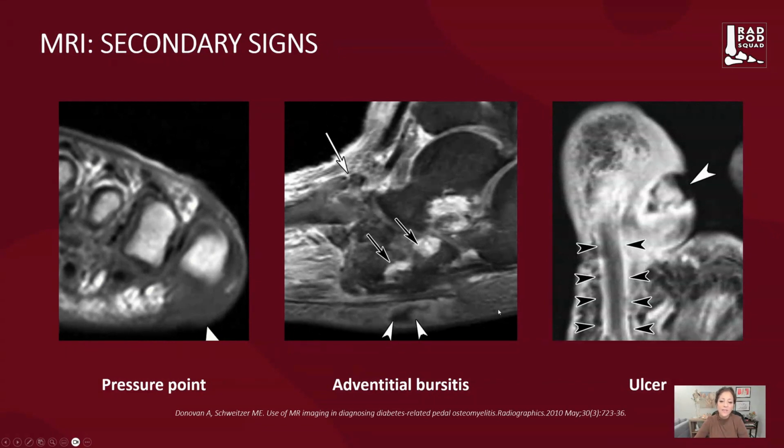So in the case where we begin to have a situation where we alter our weight bearing, in Charcot arthropathy, we begin to offload areas that are causing us pain. And in this case, we can see on this sagittal view through the hindfoot, the talus relative to the cuneiforms and metatarsals is plantarly subluxed. And that's the situation that occurs in Charcot neuroosteoarthropathy.